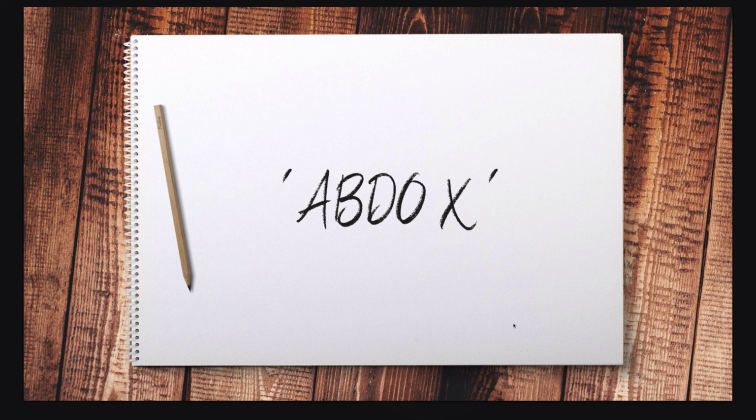Okay, so that's everything I want to tell you about abdominal x-rays and the AbdoX system. So my takeaway important messages are: first, let's really think about the place of abdominal x-rays in modern acute abdominal imaging. And for most situations, such as question mark perforation or collection or bowel obstruction or ischemia, CT is the modality of choice.